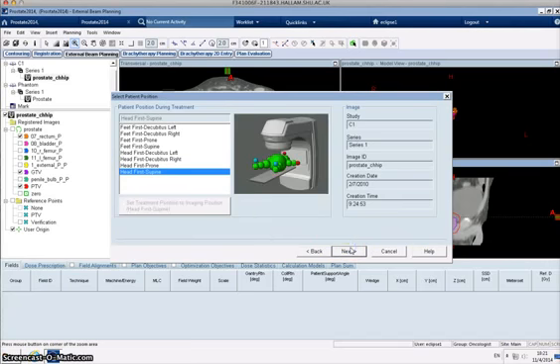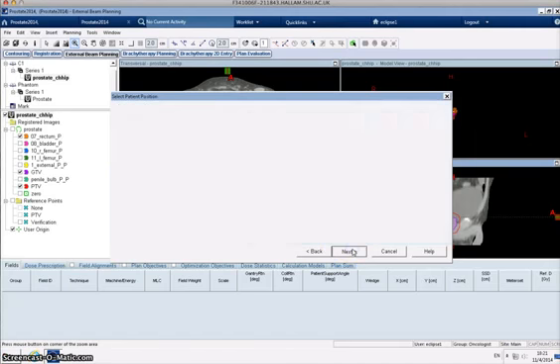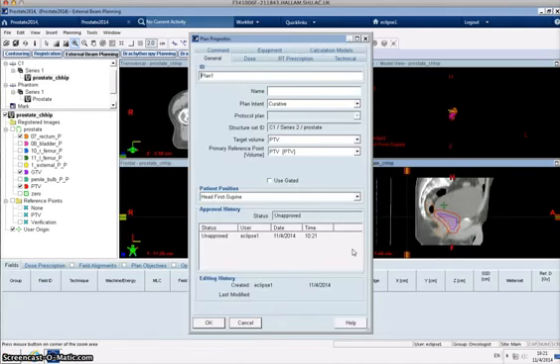Next. So essentially we can just keep clicking next to these, and the patient is laid head first supine, which is pretty important. Obviously the patient was the other way around, and the little man changes to tell us that we're in the right direction. We're going to go head first supine, and then that's our plan imported. So we can set a name for the plan.